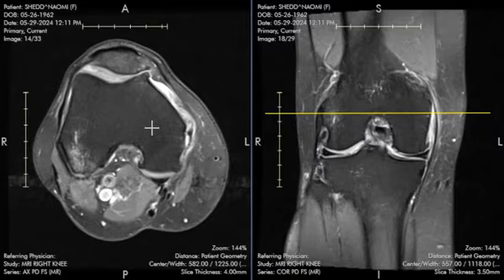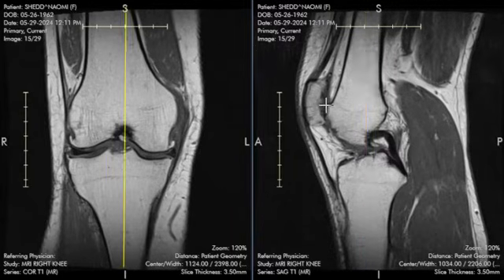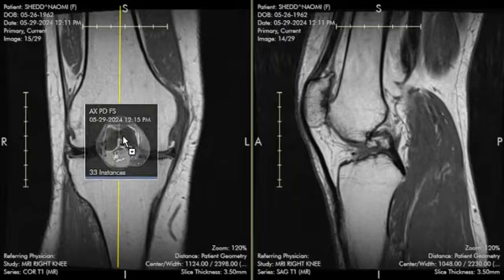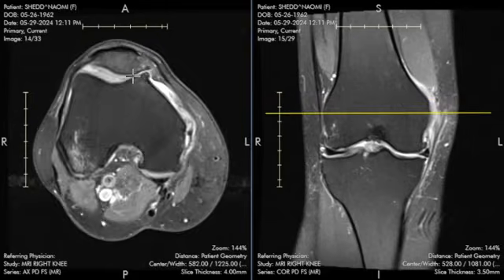Next, there's osteoarthritis of your knee. It's characterized by marginal spurring at the edges of the joint. So these little spurs represent marginal spurring. That lets me know that osteoarthritis is present, and then we grade osteoarthritis based on how thin the cartilage has become. So you have moderate to severe thinning of the medial portion of your patellofemoral compartment. This is the articular compartment underneath your kneecap. This is stable compared to your prior exam.